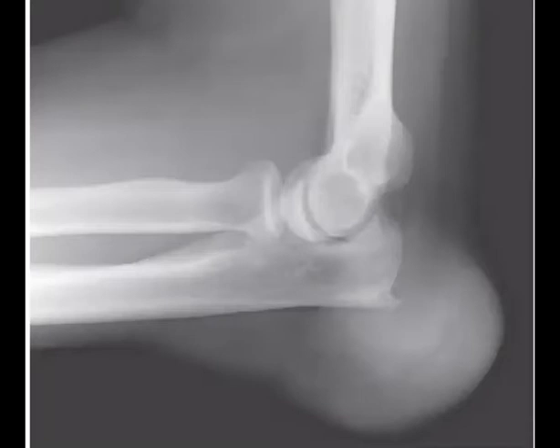In the MRI, the most important sequence to look at, if you want to prove that it is gout, is T1 or T2? T2.